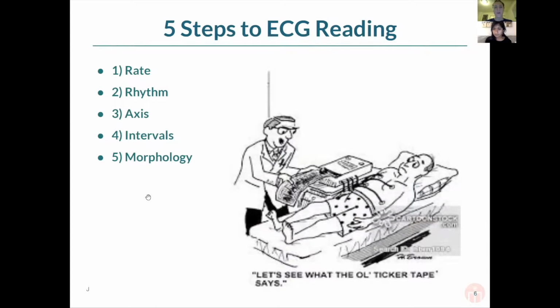So one of the best steps to reading an EKG, and which is actually what I personally do when I'm working clinically as well, is I ask myself: rate, rhythm, axis, intervals, and morphologies. And we'll be able to talk a little bit more exactly about what that means.